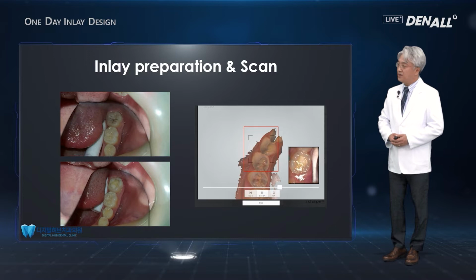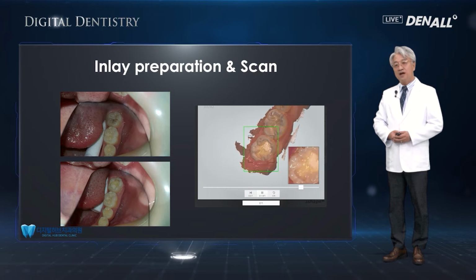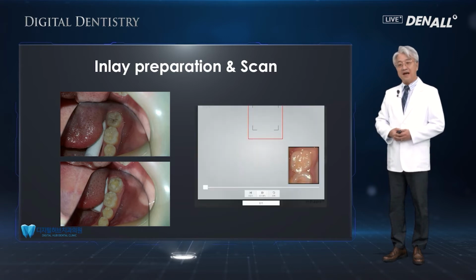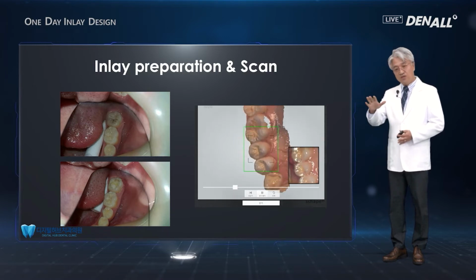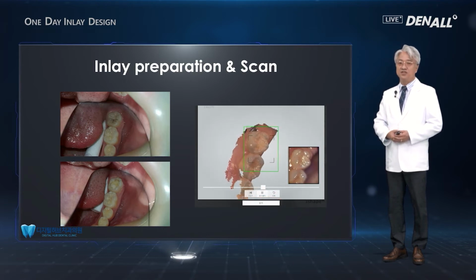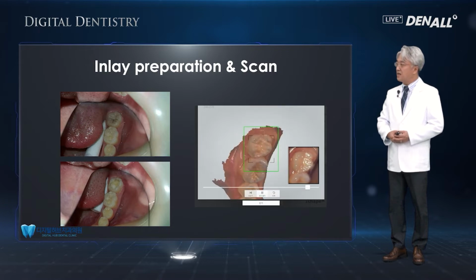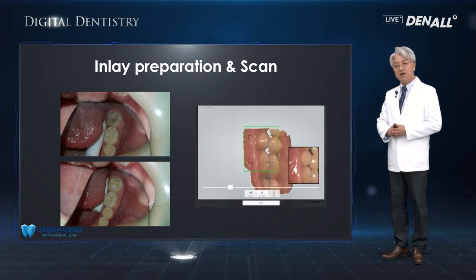Inlay scan, especially one-day inlay, is the topic of this lecture because when it comes to crown, bridge, or denture, cord packing or other steps while scanning present challenges. But in the case of inlay, if you just do thorough scanning, then without much problem, you can do good prosthesis production. So in inlay, the difficulty of scanning is the least in using the CAD-CAM.